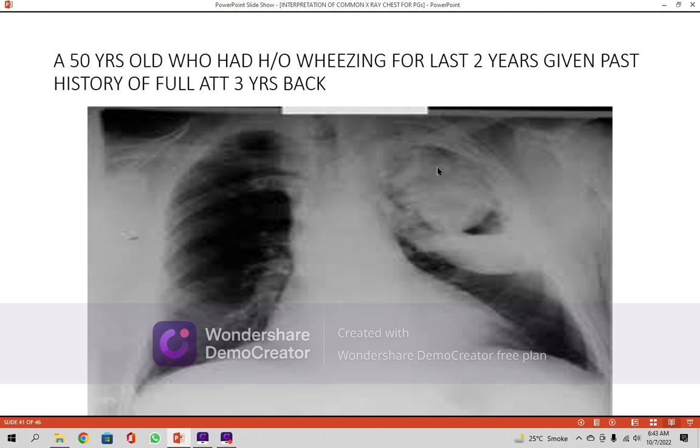It may be other fungal associated cavitations. In Wegener's granulomatosis there are small cavitating lesions. In sarcoidosis, cavitation occurs very, very rarely, and is not found with such a big opacity.